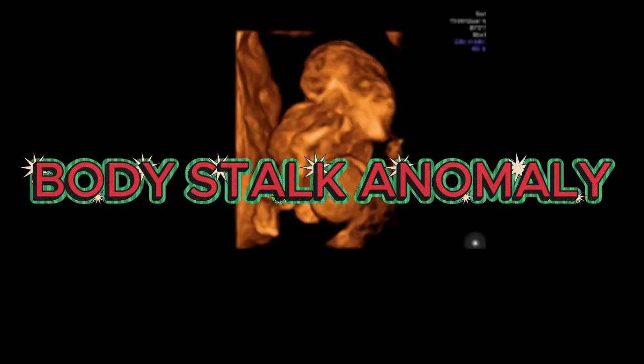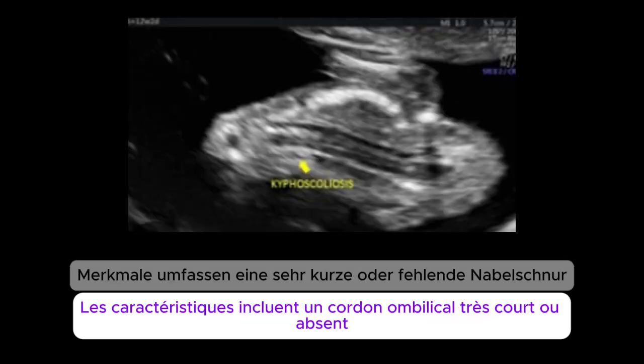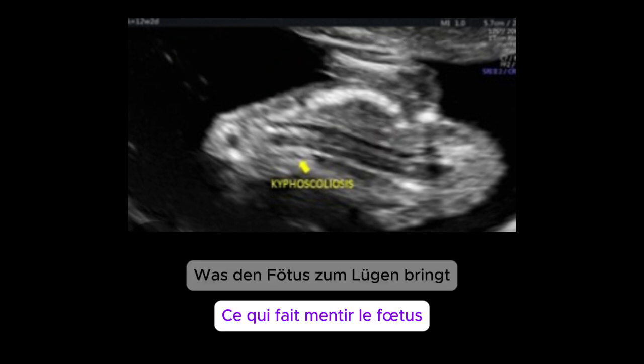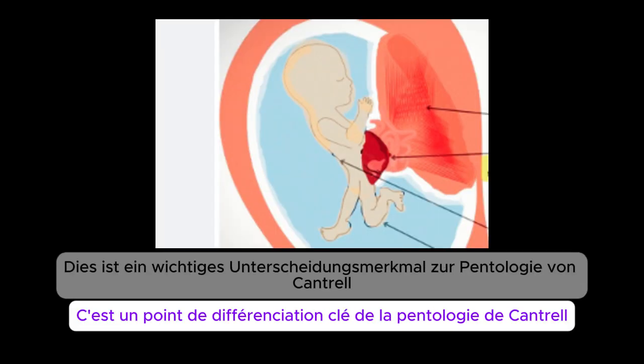Body stalk anomaly, or limb body wall complex, is a rare, lethal anterior abdominal wall defect. Features include a very short or absent umbilical cord, which causes the fetus to lie very close to the wall of the gestational sac. This is a key differentiating point from pentalogy of Cantrell.